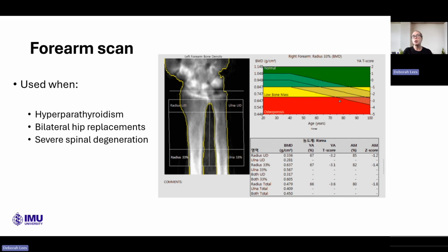And over here, you're going to look at your T-score, which is the score against the top bone mass, which is, again, a young person at peak bone density, versus your Z-score, against a matched cohort of same sex, age, and ethnicity. So you've got 2 points of comparison.